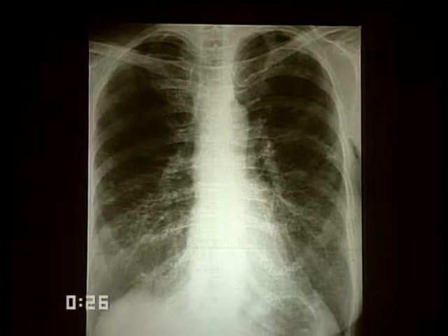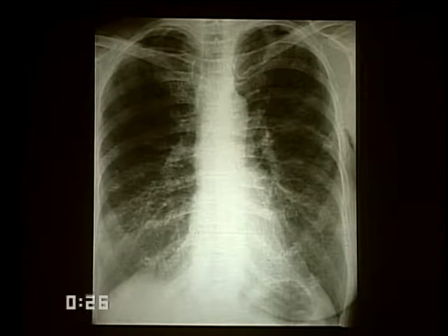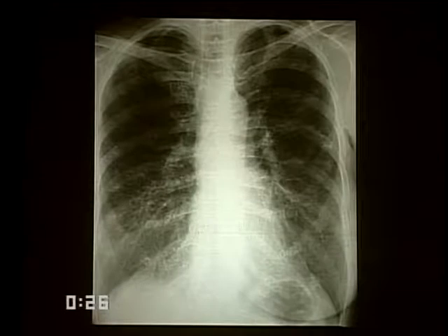Dr. McMahon referred to this particular condition, so I'll gloss by it very quickly. I'm sure this is Mycobacterium avium intracellulare infection in an immunologically normal adult individual with obstructive airways disease. We're seeing more and more of this as we look for it. It is not restricted to any particular class in society.